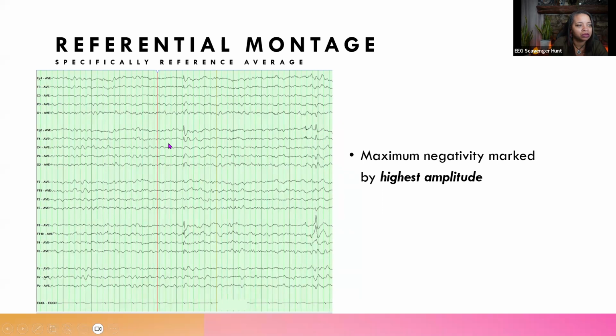So there are two epileptiform discharges on this screen. One is maximum from FP2, the other is maximum from F8, because this is the point of the highest amplitude. And when you're measuring amplitude on your screen, you start from the lowest deflection here, and you measure to the highest deflection there, and you take that as your amplitude.